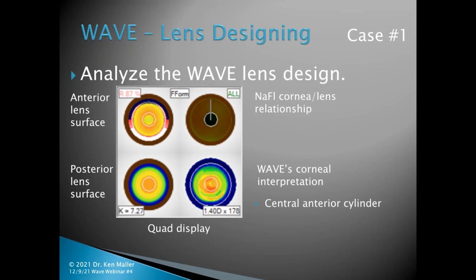And so the first thing, in the upper left, if you look very closely in the center, there's a yellow bow tie with a green tinge presenting in the center of this particular lens. And that green bow tie that's a little bit off the horizontal is sort of interlaced with the more vertical yellow bow tie, and that's representing the anterior cylinder that I put in at three-quarters of a diopter of against-the-rule cylinder.